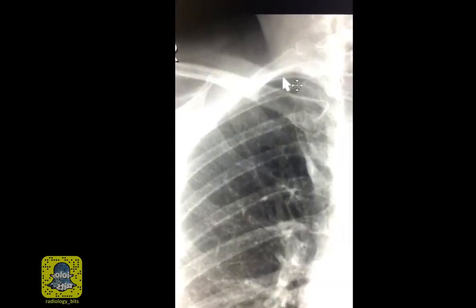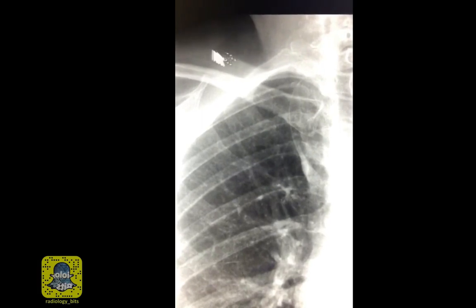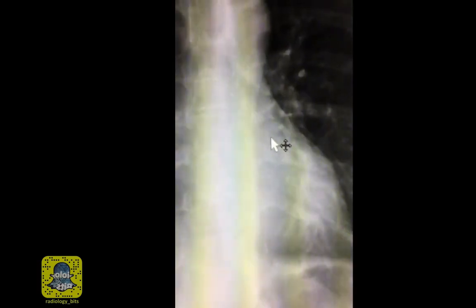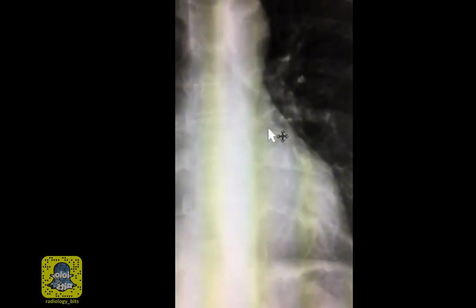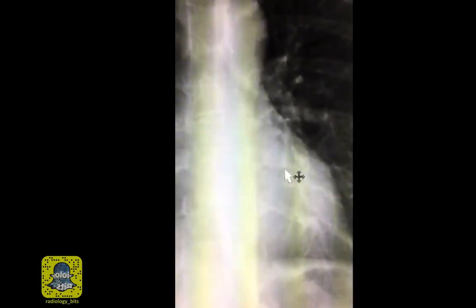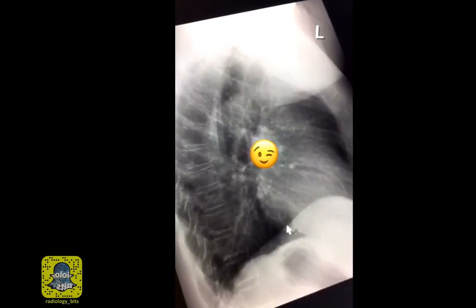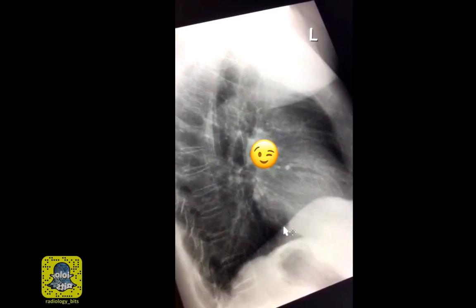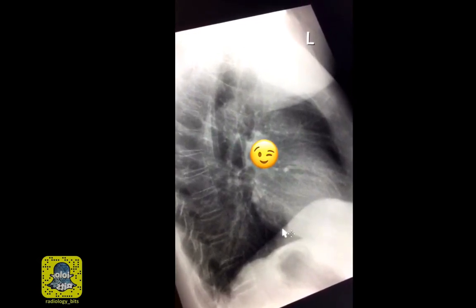The second thing we learned is that you have this additional shadow that commonly parallels the clavicle, known as the companion shadow, and this is not a periosteal reaction. And finally, we emphasize that you have to look carefully at the cardiac region, and now you know the appearance of a coronary arterial stent. You've also learned a neat term known as serpentine, something that could make you look good in front of your colleagues.